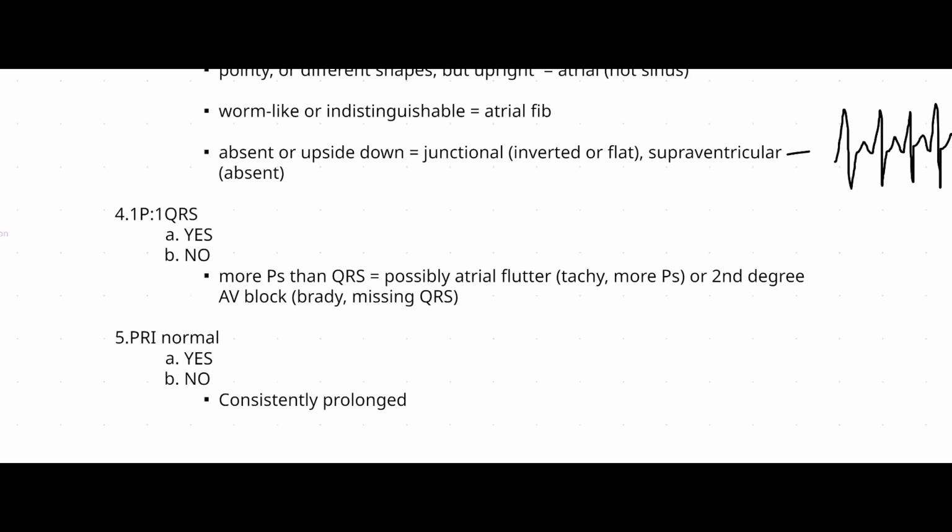So how does that look? Abnormal P, QRS, abnormal P, QRS, abnormal P, QRS. Now here, you notice there is no T. Why? Because these abnormal P's have covered them, because there's more P's. So then we count this.